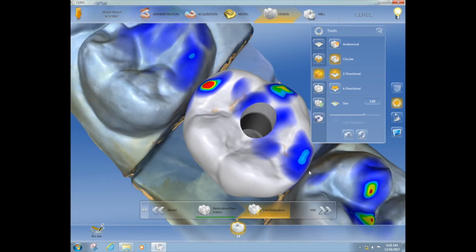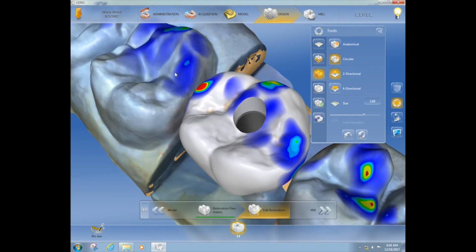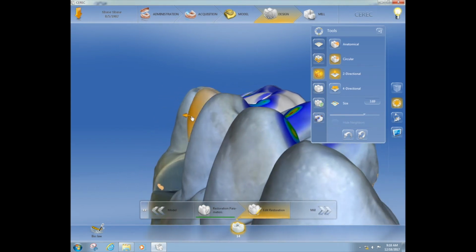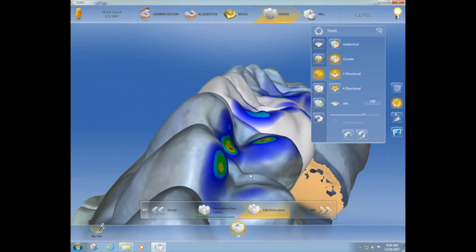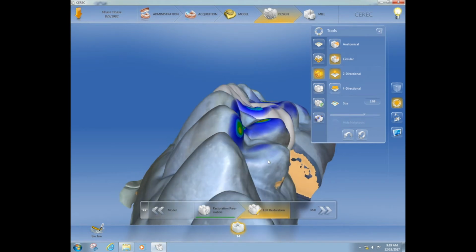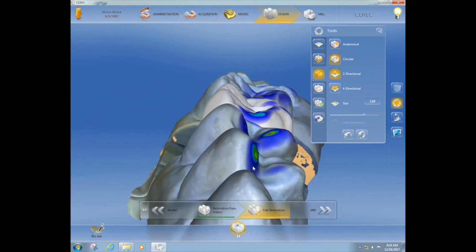Right now I'm only doing big muscle movements, like say, just kind of close the contacts. I'm ignoring the occlusal contacts right now, just kind of getting it all lined up. Looking down the buccal corridor just to see if this looks okay. You know, is that too bulked or is not enough? Since it was placed a little bit poorly, we'll have a little bit of extra space here. I'm going to go later in and smooth this, but for now I'm just kind of showing you getting it into the arch form. Make it look pretty good. So it looks to me a little bulky back here, but overall not bad.